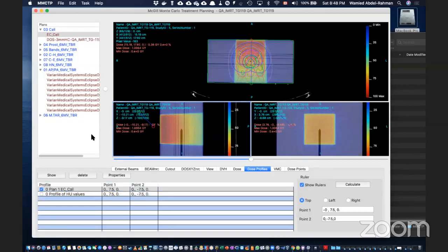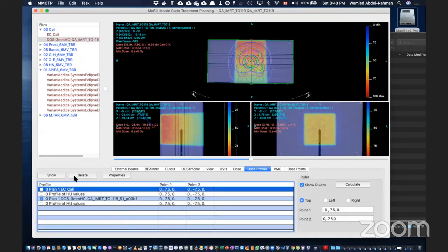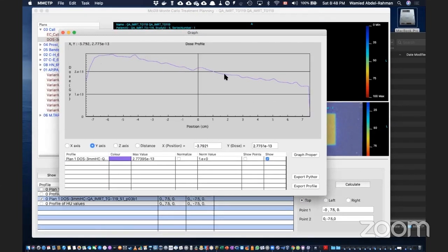Now, let's do the same thing, but now I'm going to select the Monte Carlo plan and keep this the same. So I'm going to calculate. Now this is for the Monte Carlo plan, and I'm going to show it again. You see, this is a bit noisy. It's Monte Carlo, it's obvious, right? But I then need to modify. I need to make this calibration so that that particular amount of dose per particle is equivalent to 100 centigray, for example.